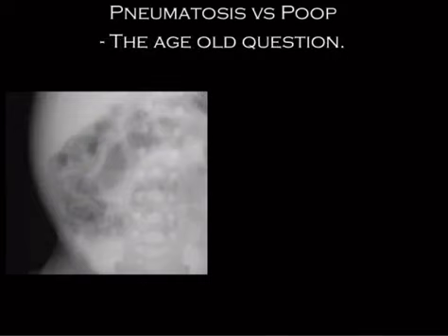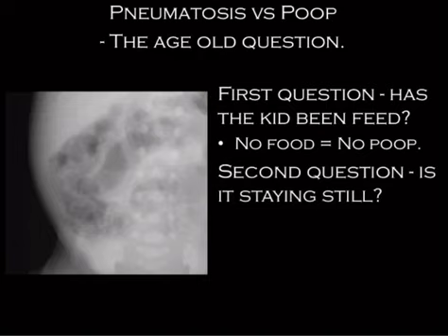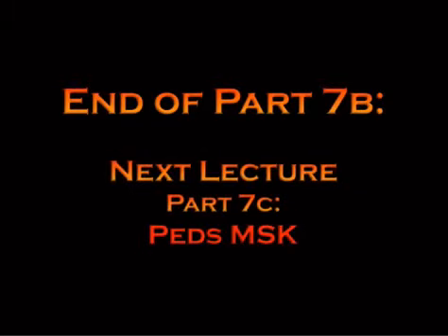So mentioned this once before, pneumatosis versus poop. The age-old question, remember to ask, has that kid been fed? No food equals no poop. And then watching it on serial exams, does it stay still? Poop should move. All right, so that's the end of the GI talk, and the next talk is an MSK talk with peds.